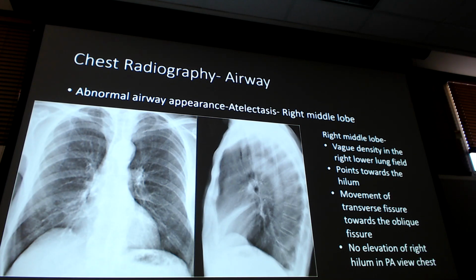So if I were to combine what I know about pneumonia, that it's a patchy alveolar disease, along with the fact of does this patient have any sick type symptoms, that should be a good portion to help me go atelectasis versus maybe pneumonia, right? Especially when we're at the stage to where there's not a whole lot of pulling going on yet because of where it's at, right? My mediastinum looks like it's where it's supposed to be. Outside of that silhouette sign, everything is pretty well lined up where it's supposed to be. Because it's a smaller one, it's an early stage. So this just goes to show that not all of them will pull the structures over. But it's something you should evaluate and look at when you're trying to distinguish if there's one there or not.